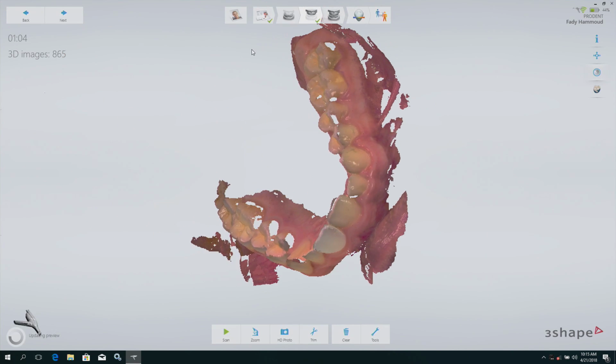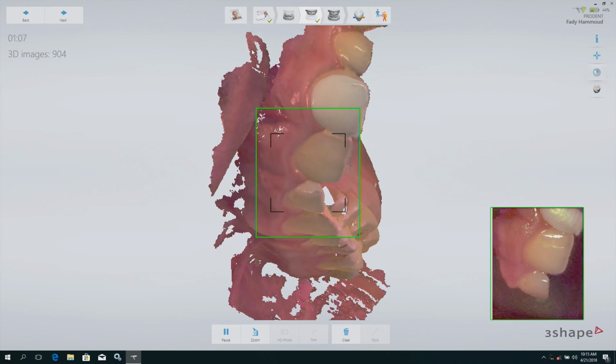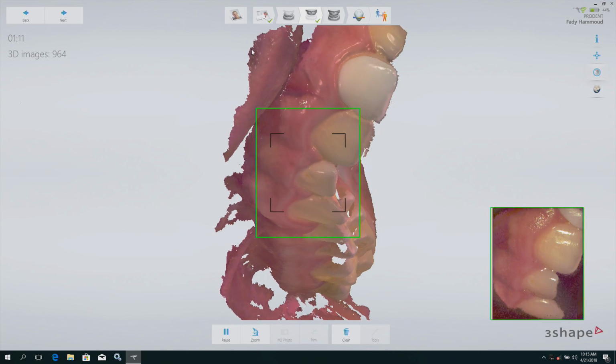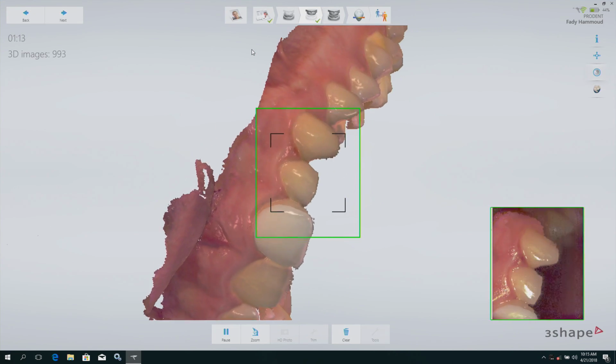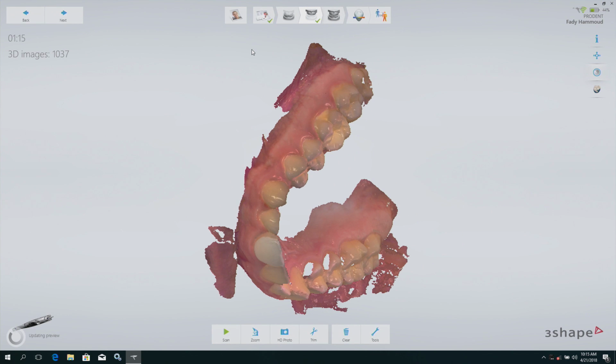Sorry. If you're lost, you can switch again, wait for the camera to find where it is, and complete if necessary. As you see on the screen, it's not touch screen.